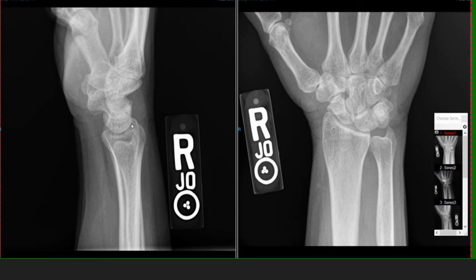So this is the radius bone, and then the first wrist bone that we're going to encounter here is the lunate bone. That's going to be a central bone involved with both the radiolunate angle and the scapholunate angle. And then here is the scaphoid bone, sort of oriented this way. These are the two measurements we're going to construct here.